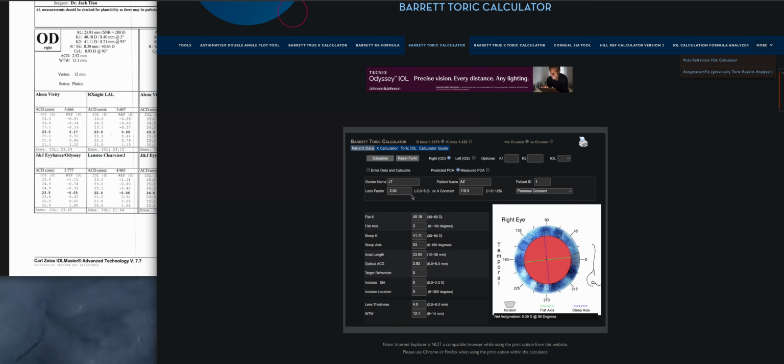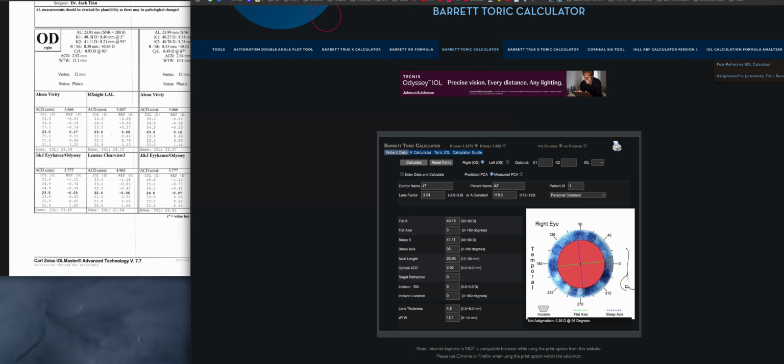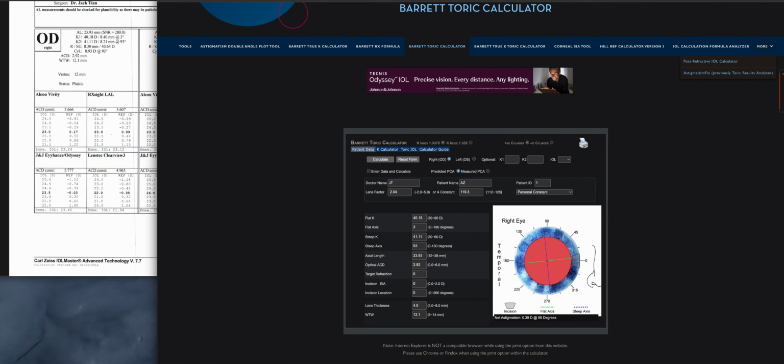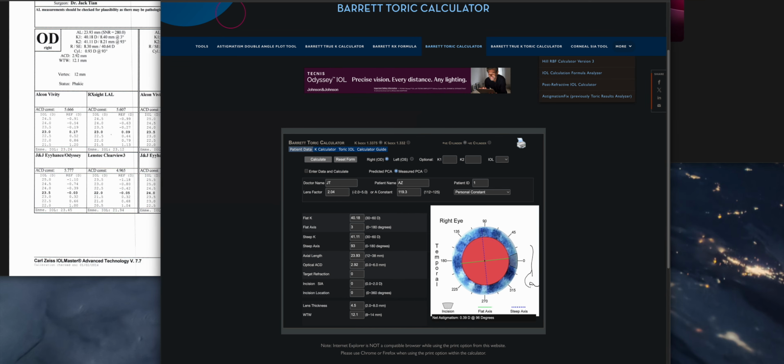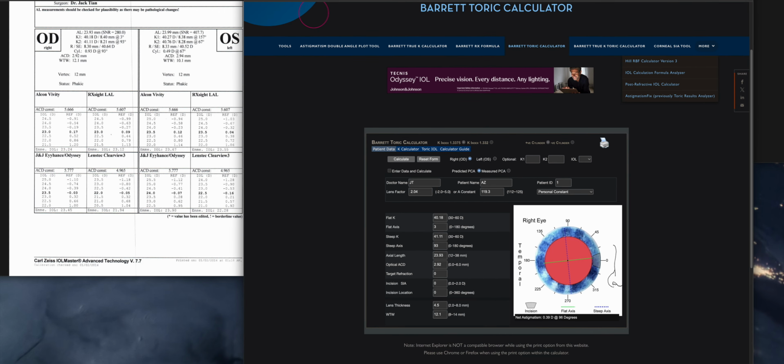Now we're going to take a look, and I'll just move this on over to the other side. Actually, you know what? I'll make this a little. I'll just scroll over here. Sorry, I'm going a little slow. I don't want to review any patient data.